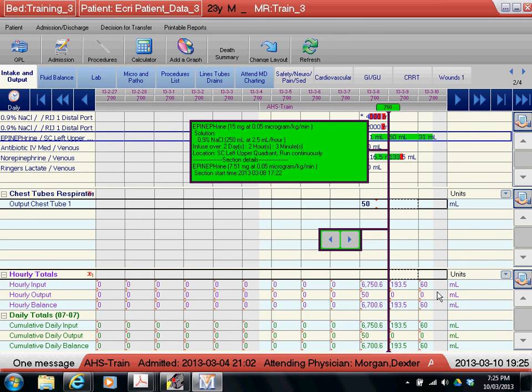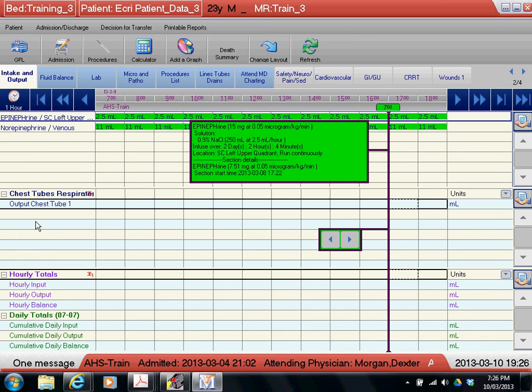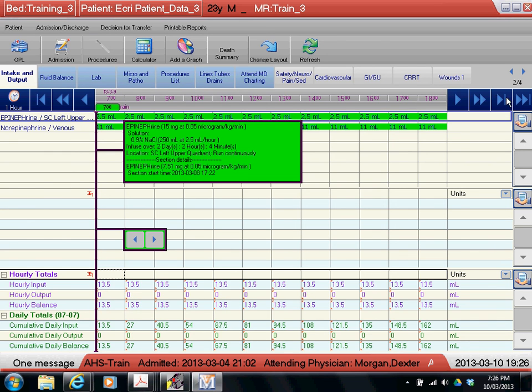the totals. Now, the whole hourly inputs and then the daily totals are here, and we can see that for the daily totals, you can see the patient's total daily in, total daily out, and then their balances for each of those days. To return back to the normal views, you just change your time intervals, and then your time intervals go back to the way they were before.